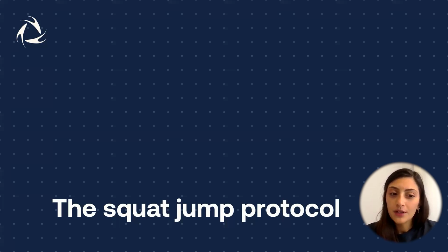Okay, so we wanted to give you a practical example of what we can do with the system. We are going to provide a detailed analysis of a squat jump using, of course, the squat jump protocol, and using some videos we'll go through all the steps needed to calibrate the system, to perform an acquisition, to post-process the data and get the report. And together we'll also discuss the obtained results, looking at the main parameters that can be useful to assess the athlete's performance.